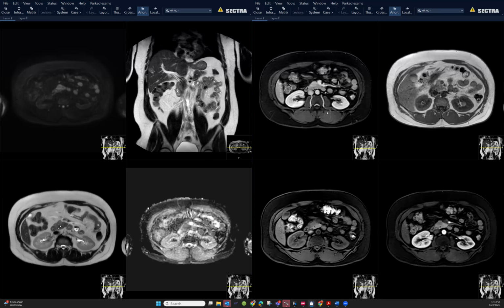Okay. Agree. PET was positive. It smells like pancreatic cancer. It looks like pancreatic cancer, and it could be IgG4. The biopsy can be really difficult because it causes a lot of fibrosis, so often you don't get as much of the IgG4 cells. We've sometimes had to do big core biopsies to even meet the criteria, and to also see all the other stuff like storiform fibrosis and the lymphoplasmacytic infiltrates.